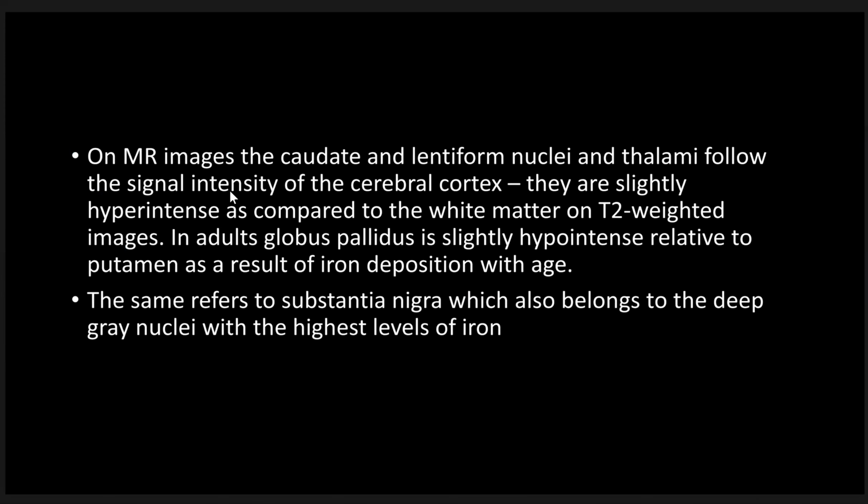On the MRI image, the caudate and the lentiform nuclei and the thalami follow the signal intensity of the cerebral cortex. They are slightly hyperintense compared to the white matter on the T2 images.